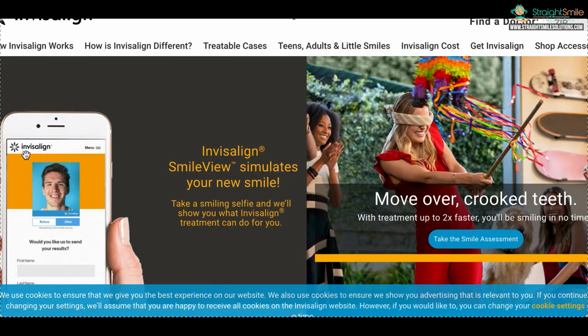They're going to take one 180-degree video that kind of spans across with their aligners in. They're going to take an anterior open bite photo with the aligners in. And then I think they're going to take a photo with the aligners out. 2 more photos. I think the other one's with the aligners out, but you get the idea.